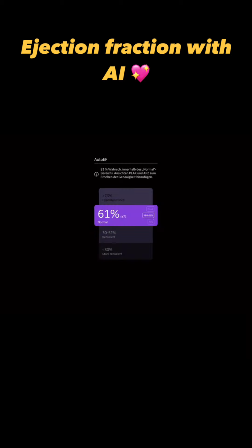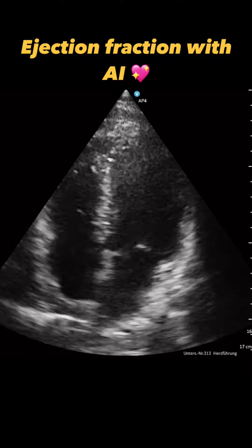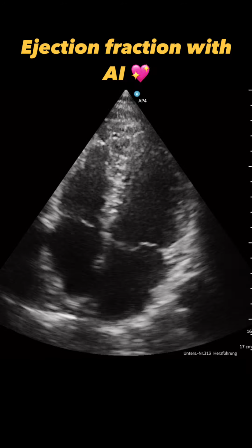Here you have several measurements with different loops in the same patient, and it always shows a very similar end result, which is a normal ejection fraction. Also with the visual assessment, I would be in the range of around 60%.